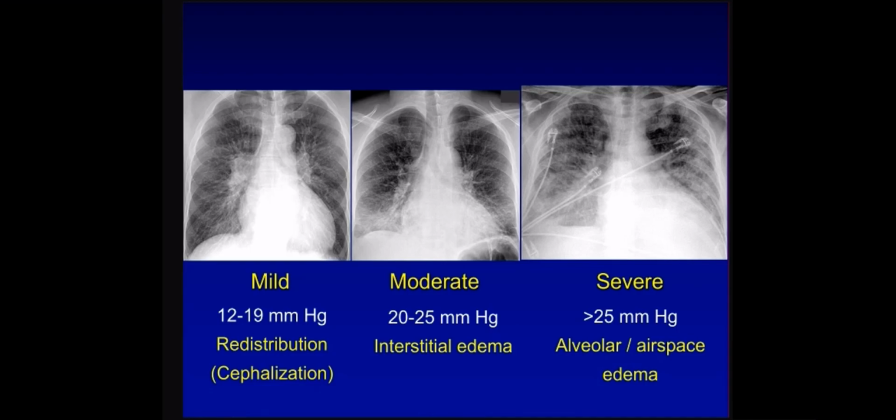It's so-called alveolar edema. It can very closely mimic pneumonia or aspiration or even pulmonary hemorrhage. Notice now the blurred vessels are even more blurry, and there's a lot more going on here, some fluffy, indistinct white opacity in both lungs, and very subtle interlobular septal thickening, which is there. It's just harder to see now in the presence of this airspace opacity.